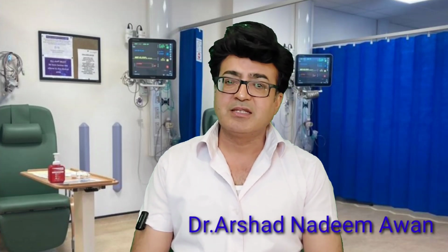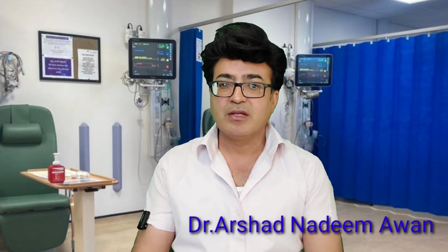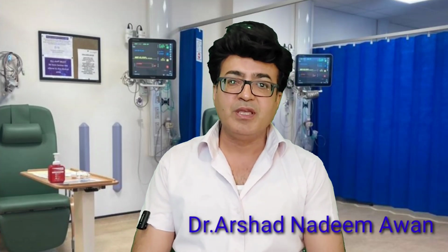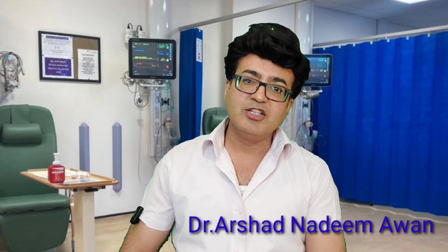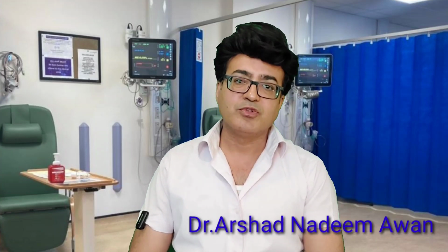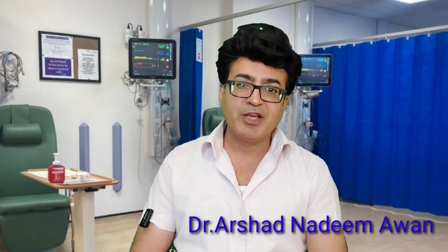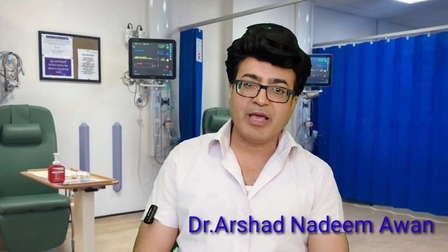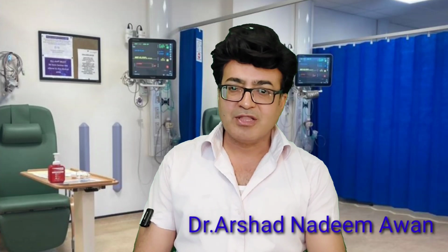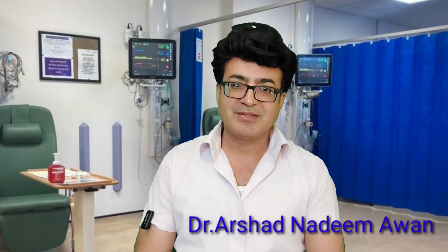Another important thing, because of PID, there is a likely chance of getting ovarian vein thrombosis. So if there is PID and if there is endometrial infection, there is a likely chance of ovarian vein thrombosis and ovarian vein thrombophlebitis. So all this is information you will pick up on these ultrasound images. So let's start watching these images, pick up all this information and write a conclusive report.